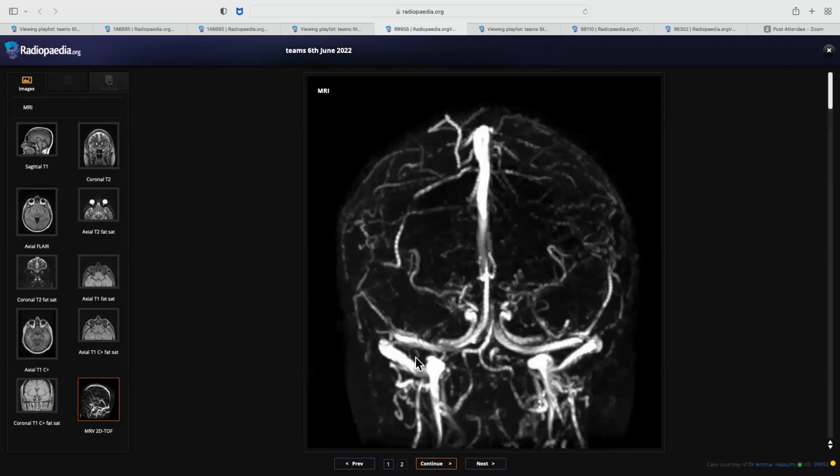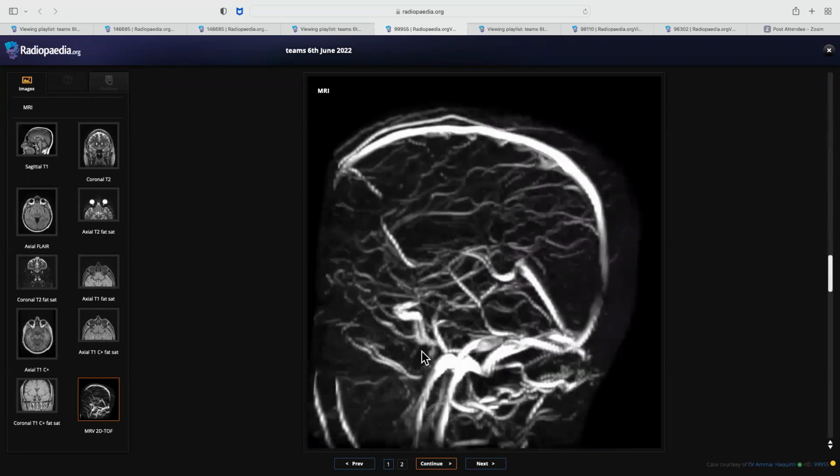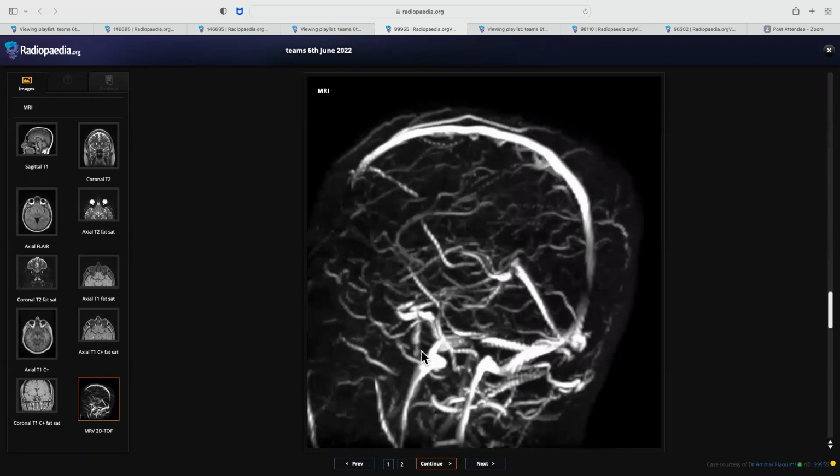So what will you see in the venous sinuses in a case of benign intracranial hypertension? It will show attenuation of the dural venous sinuses, most likely in the lateral portion of the transverse sinuses. Okay. What else do you see in benign intracranial hypertension? Anything else in the brain? There can be a partially empty sella, like there is compression of the pituitary parenchyma.